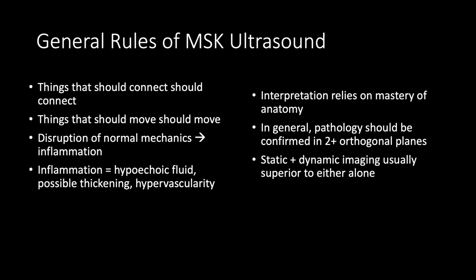Anytime that mechanics are disrupted, there is a risk of an inflammatory response, which generally shows up as first edema, meaning that we'll see hypoechoic fluid on ultrasound, followed by tissue thickening if this inflammatory process is long-standing and the edema continues. And then there is some possibility of something called hypervascularity, as blood vessels will grow in to supply that injured tissue with nutrients and oxygen to help the body's process of self-maintenance and healing.